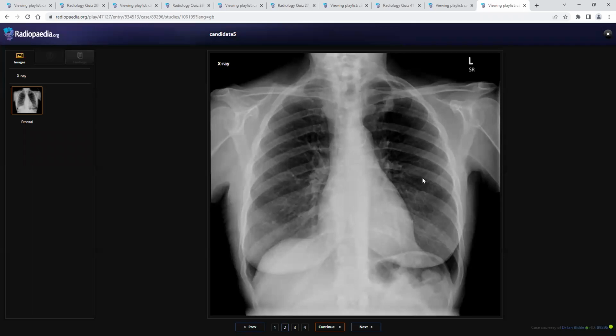That's why the weight loss. He was also presenting with weight loss, and his dysphagia symptoms may not be related to this, but he had a lesion at the left apical region. So this is your review area. Okay, you should consider this. This is early stage of lung cancer.